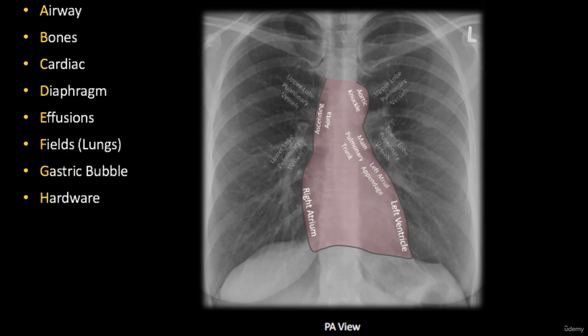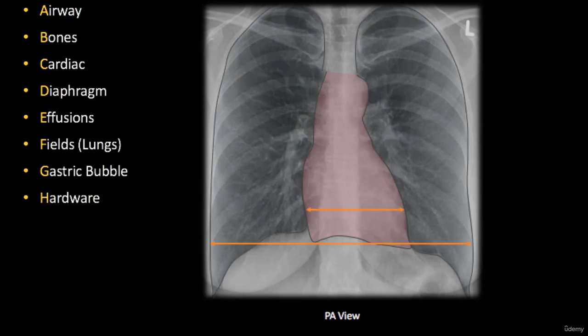This part of the heart may be damaged in case of trauma, and the left border of the heart is made by the left atrium above and by the left ventricle below. The diaphragmatic surface of the heart lies almost completely on the diaphragm. From here the name.